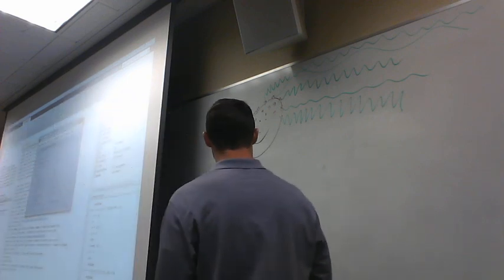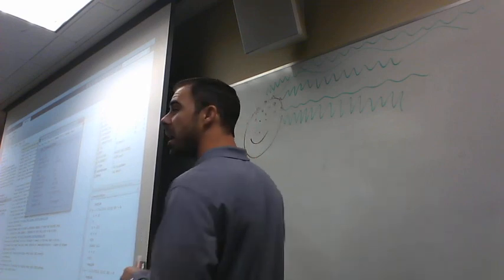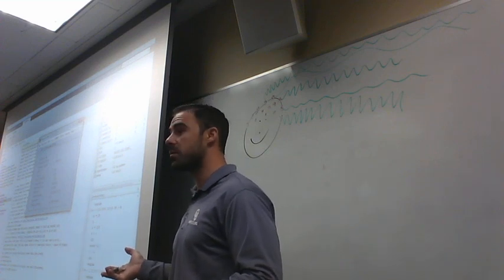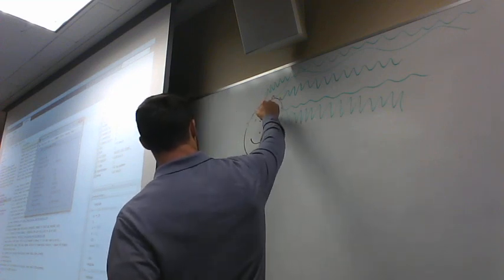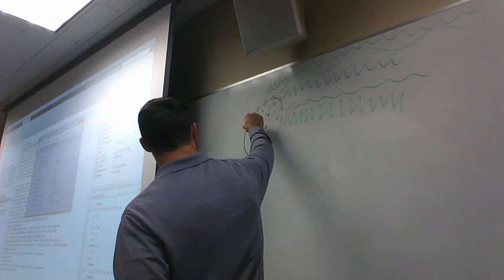Channels per frame. This is just basically channels per frame. What they're referring to is how many electrodes they have identified. So here they have 38. Now we also said that we started with 32. Well, that's weird. But then we said, oh, well, there's actually a 34th and a 33rd mastoids that we referenced to. But we also have some electrodes that you already know about. Beyond our 32 brain site electrodes, we have those eye electrodes that gave us those blinks that we saw last class, remember? So those are basically recorded one here, one here, one here, and one here.